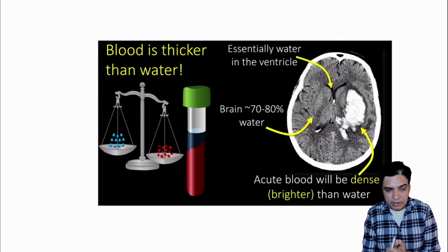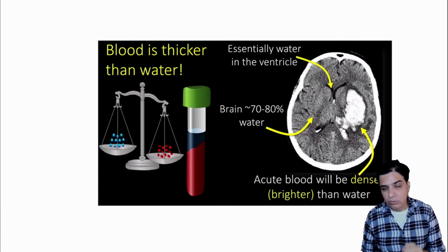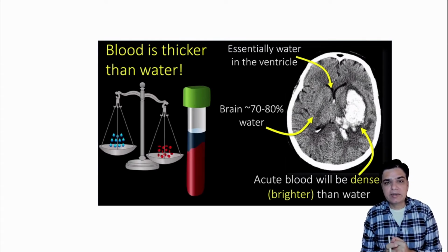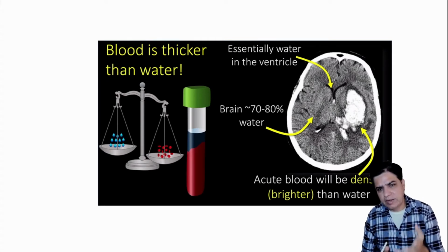You would see it in the lateral ventricles, in the third ventricle, in the fourth ventricle, and in the areas around the brain, between the meninges. There you would see them as black lines, black shades. Blood, an acute bleed, would always show up as white dense images on CT scan. So remember, anything apart from bone that has a tinge of white on the brain, especially in the context that I explained earlier, probably means that it is blood.